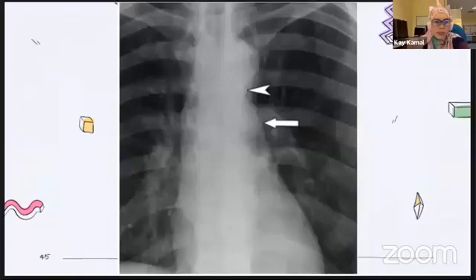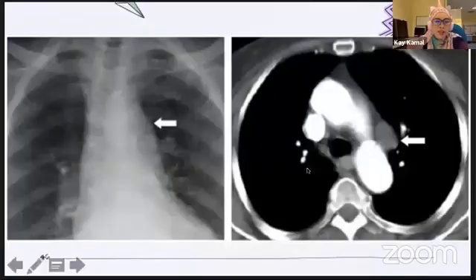Okay. And abnormalities in the AP window, usually we see lymphadenopathies. You see what just now? This is the aortic knob, and we're supposed to have the convexity over here, but it is lost. And when we see in the CT scan, there's a mass over here, and this particular image is a lymphadenopathy.